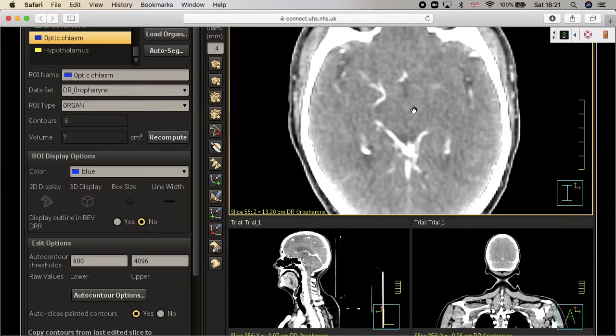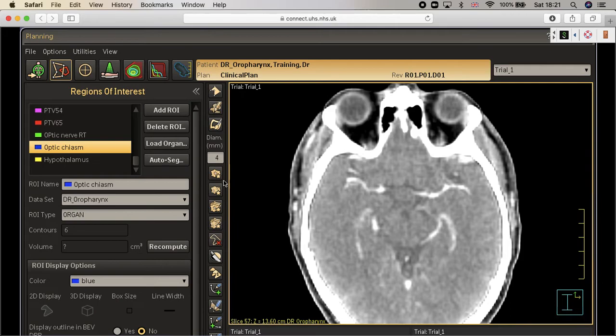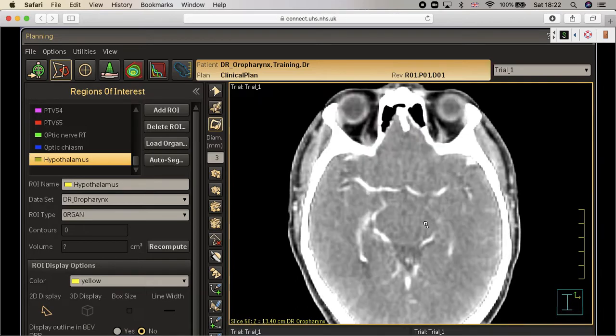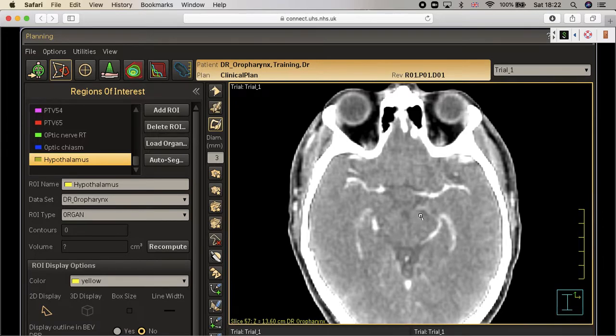The guidelines would tell you something very nice, and I will get for you the guidelines on an MRI to see how we can do the hypothalamus. But before going to that, let's see how we can draw the hypothalamus on a CT scan. If you localize what I'm calling the optic tract, when we talked about the optic tract just now, you will see in between the limbs of the optic tract there are small beads. These beads are the mammillary bodies. In the new guidelines, they tell you you can draw the mammillary bodies as part of the hypothalamus, so there is no harm in doing that.